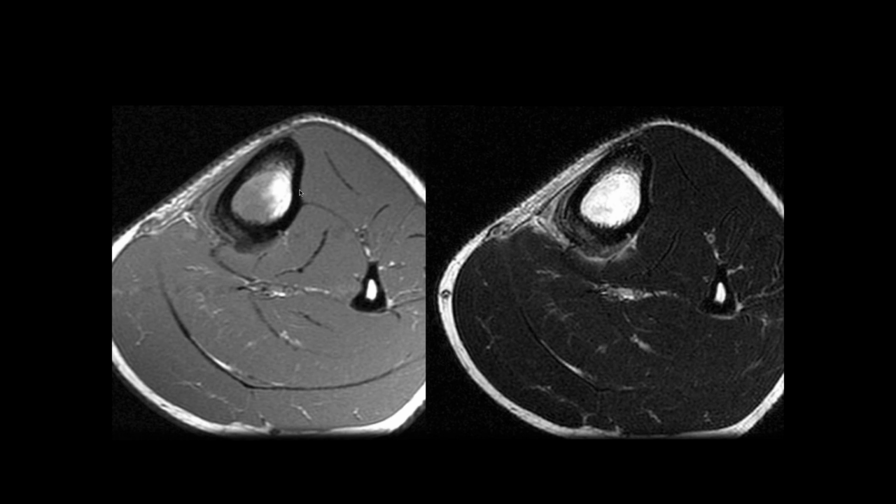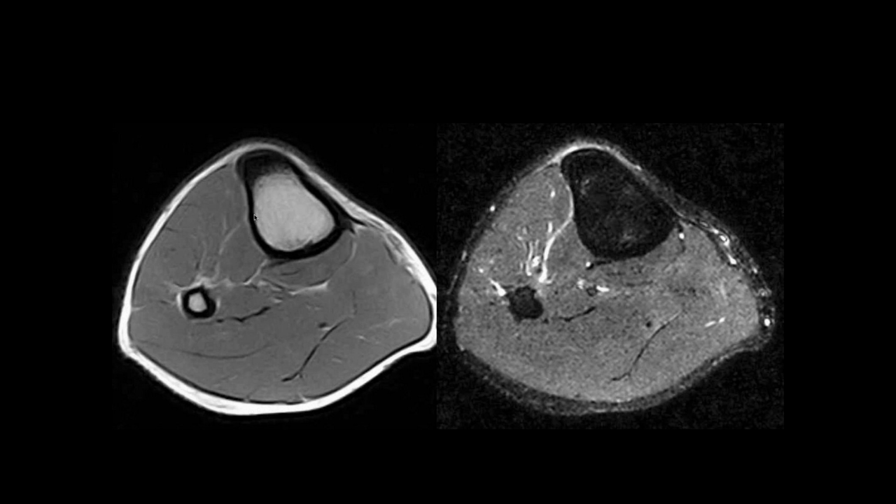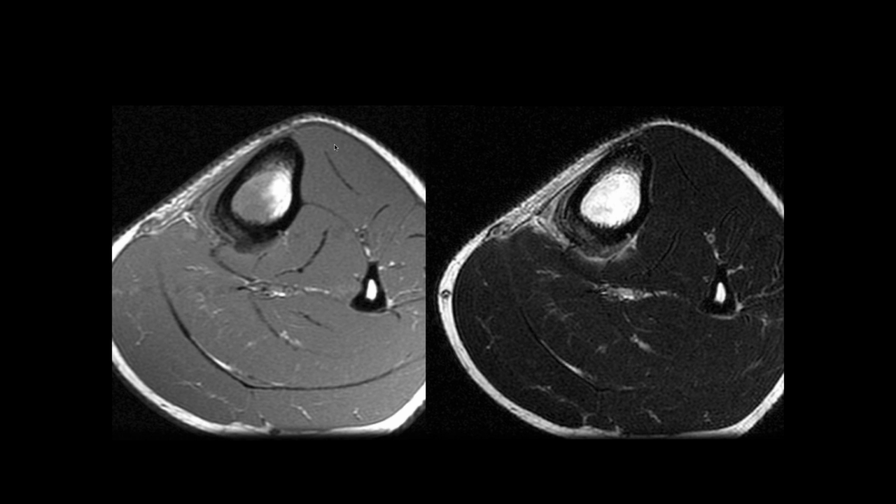Okay, so here we see some edema within the medial aspect of the tibia, and the periosteum looks a little thickened posteriorly. Lateral aspect of the tibia. Okay, yeah, I thought it was the medial. This is a T1 weighted image, so this is bright fat, and this would be loss of the fat signal on the medial side. On the T2 weighted image, the fat and the edema are similar signal intensities, so we kind of obscure that.